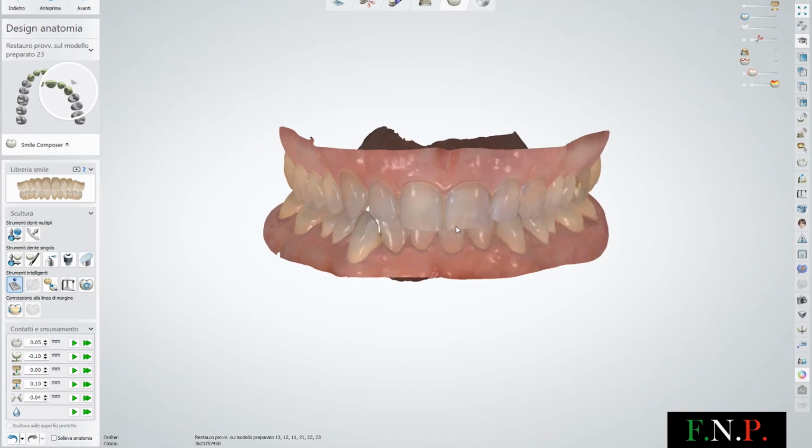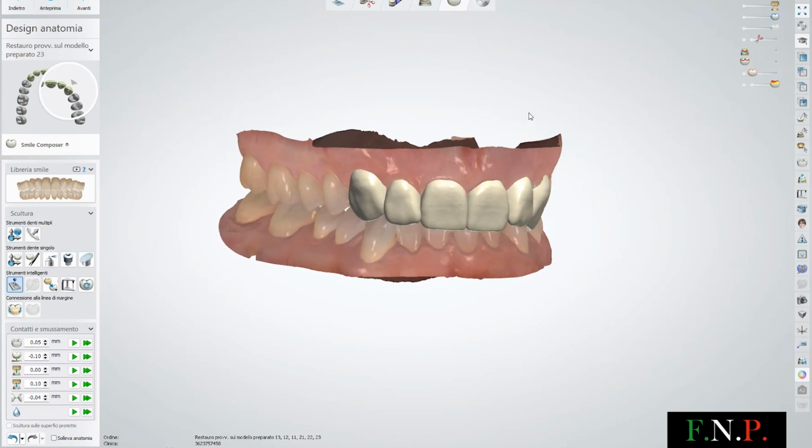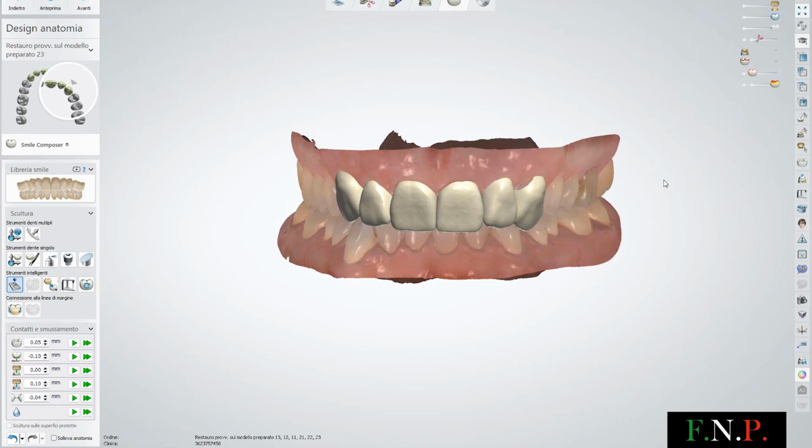I get the patient's intraoral scan from Dr. Marco Valenti directly on 3Shape Communicate. I then digitally model the incisor teeth, changing the shape in order to change the aesthetic outcome. Now I am going to download the face scan file that Dr. Marco sent me, and we're going to upload it on the Dental System software.